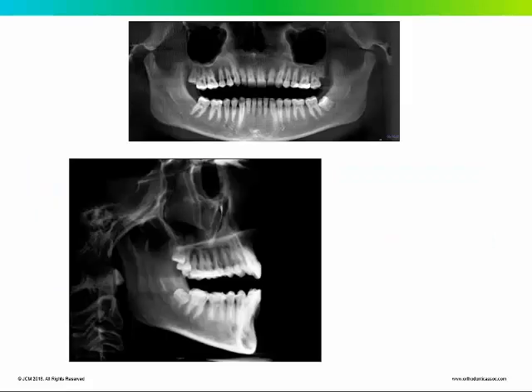When we talk about using the alveolar housing anatomy to more properly position the roots of the incisors, I think it would make sense to just compare it to a cephalometric and panoramic image. Here we have a patient that's 5 years post-active orthodontic treatment. If you were to look at the reconstructed pan and ceph, these images are reconstructed from the cone beam CT. Obviously, the cephalometric reconstruction is taken out of occlusion. There are reasons for that, but they are not germane to this talk.